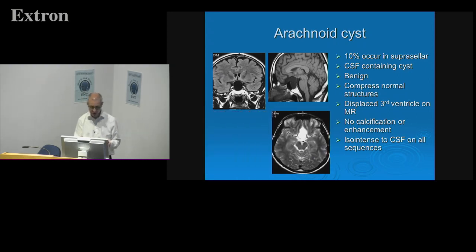Again, just showing that very bright T2 signal, the same as the CSF. But interestingly, that kind of just makes a point for me, actually. So there between the cerebral peduncles here, you can see in the interpeduncular fossa, you get turbulent flow there, and so it's actually less bright than on the T2 here, which has got no flow within it.